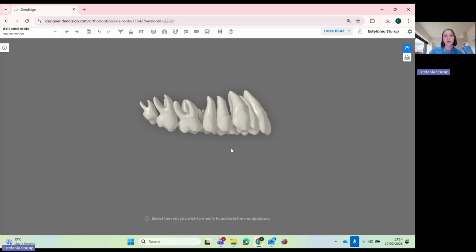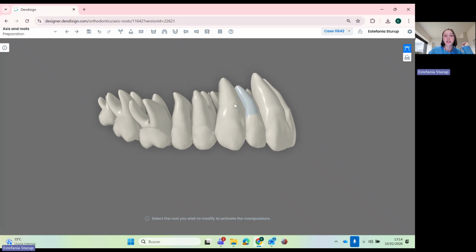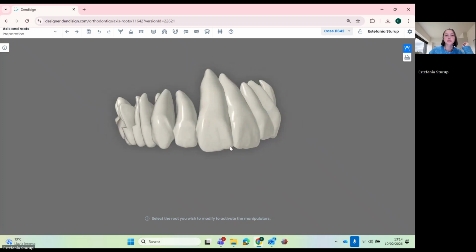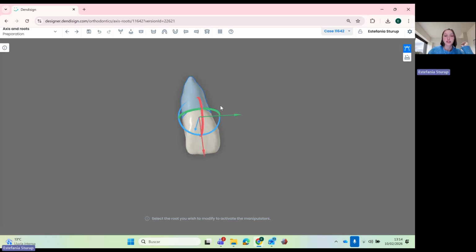Okay, now we can go ahead and go on other views and fix any little detail we like to fix. Okay, good. This one. Perfect.